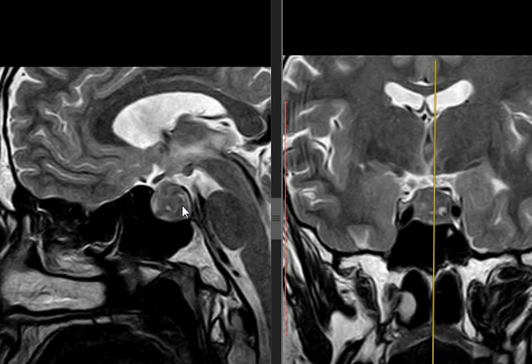So this is a pituitary mass. It's extra-axial. What could it be? If the size of the mass is more than 10 mm, let's measure it. It is almost 16.